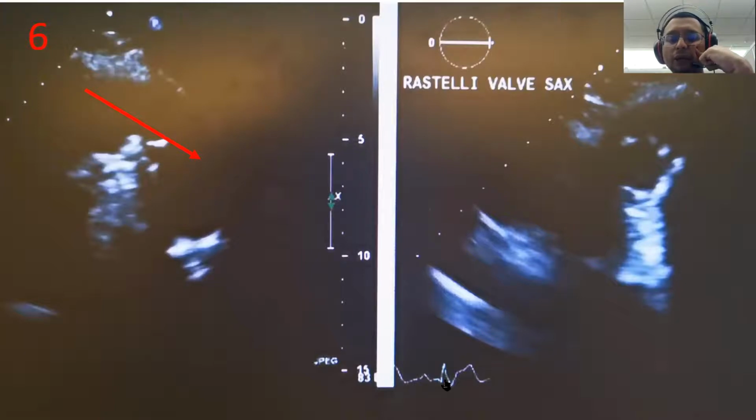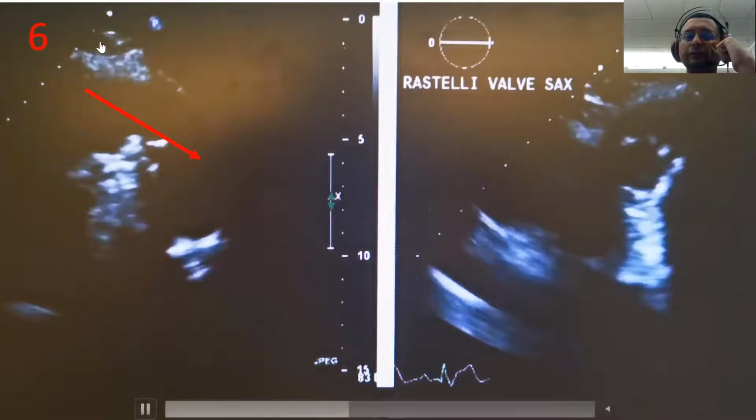So your blood goes to the left atrium, to the left ventricle, and then to the pulmonary artery, and back again to the left ventricle, and then the right side. So it never mixes. That's why we have to do the procedure. Okay? All right. So CCTGA is AV and VA discordant. DTGA is only VA discordant.